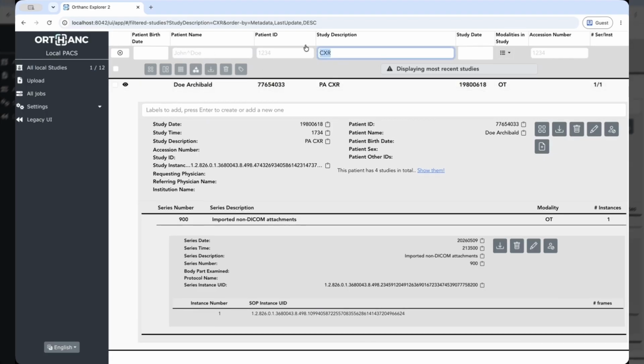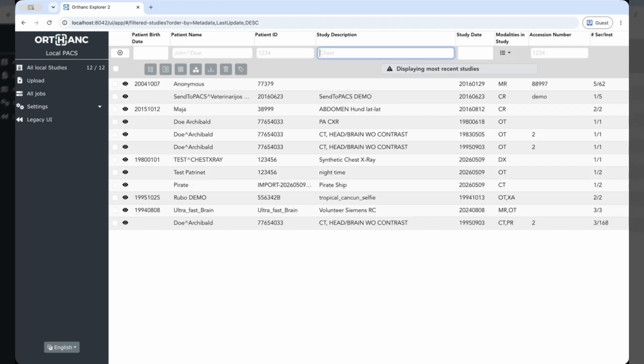How would I do this? That's another important thing. Let's get rid of the filtering. The reason why I'm only seeing one study out here is because of this filter. If I remove it, then it's open season, and any study that exists can be easily viewed.